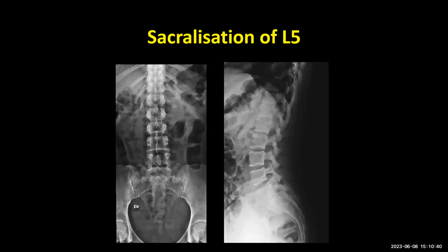This is another case. Again, you can see that you have x-rays. The last ribs, you presume them to be articulating with T12. Counting again, 1, 2, 3, 4. Now what has happened to 5? You can see that the 5 is fused with the sacrum. It's part of the sacral ala. So this is a case in which there is sacralization of L5. So x-rays can be very useful, and if they are available, it's always a good idea to have a look at them.